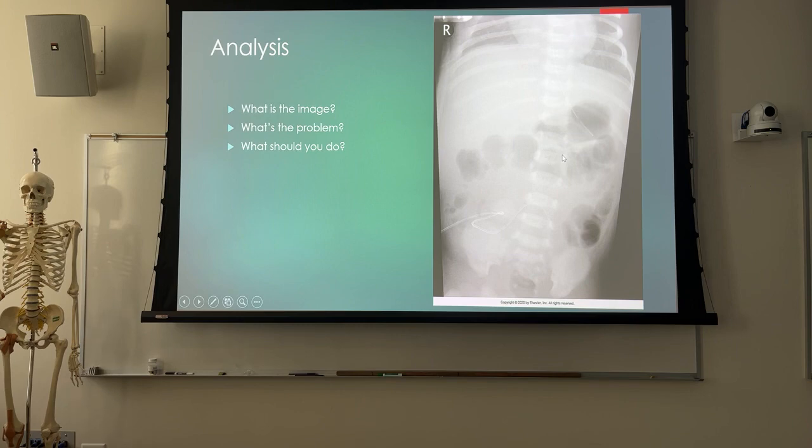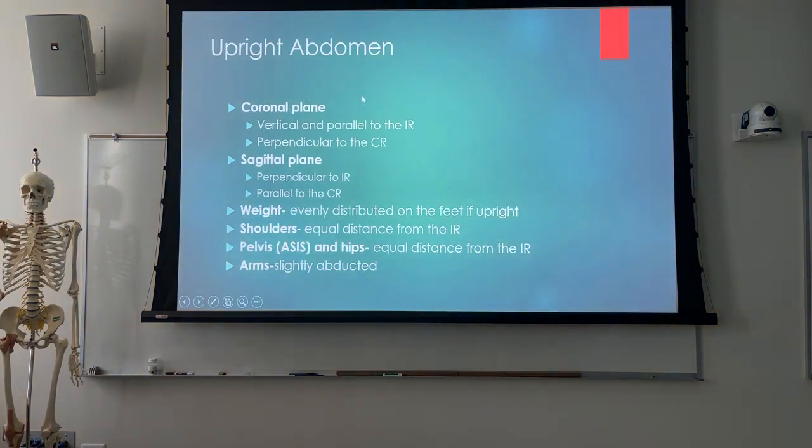Chances are, if you're shooting for a UVC placement, the doctor's standing right there. Do you need another one? No. And if he or she says no, then you're golden, right? But would you do this better the next time? Yes, yeah, better.